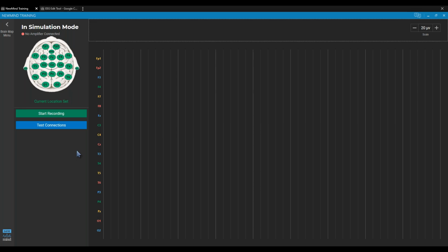I think part of your question, Andrea, was about shutting off the auto artifact just to get it to go. Is that correct? I'm trying to read through this. Yeah, I saw changes. The map was stopping, and it was stopping for too long.